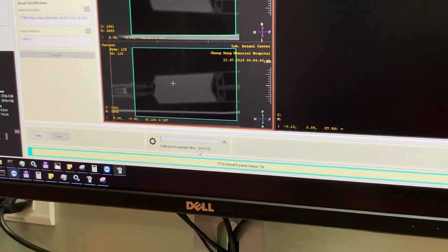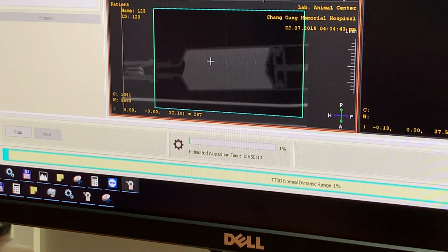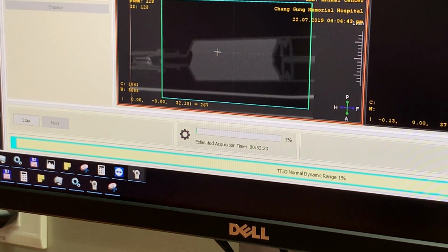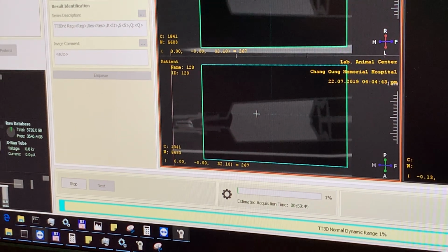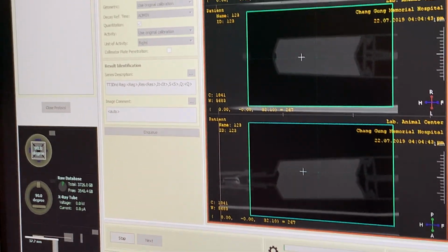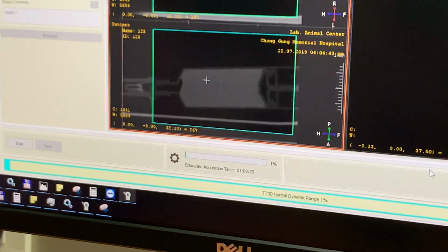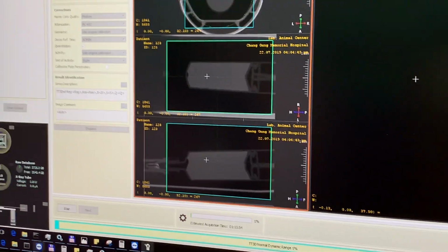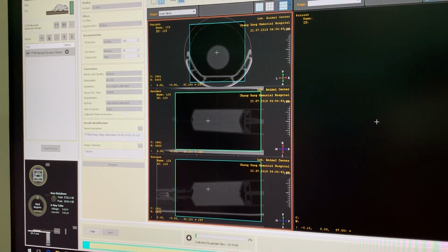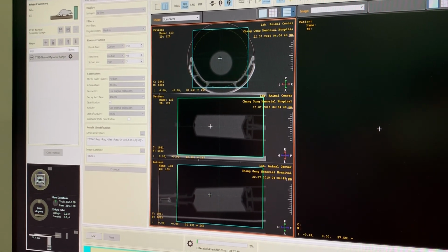While we are waiting for that, I want to show you how the multi-cell software is built up. Do you remember what it does? What it is used for? It's for the vital monitoring and gating and bed heating and everything.